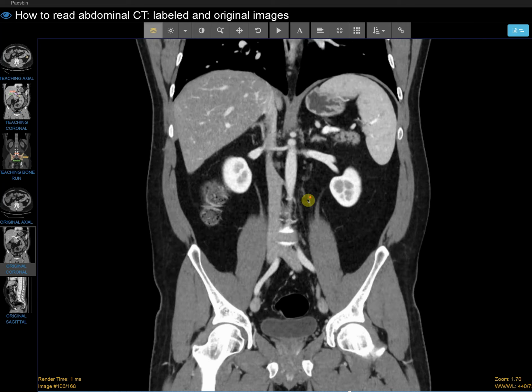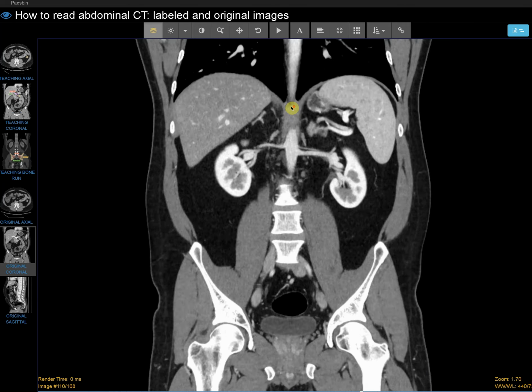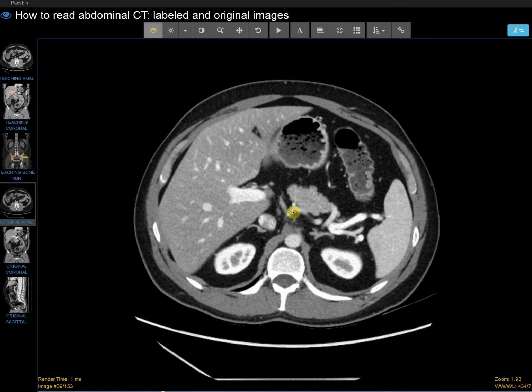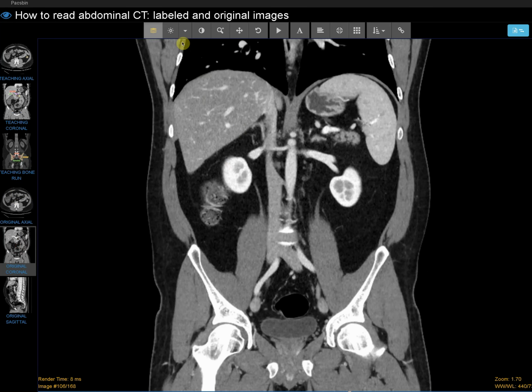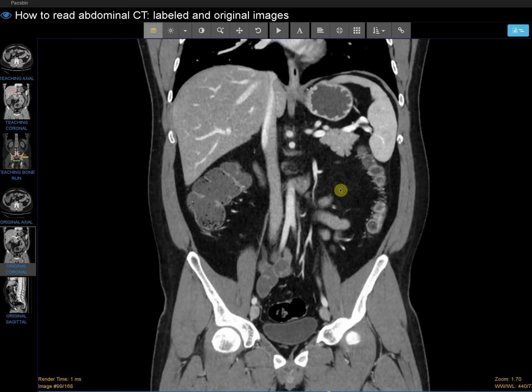After that, let's take a look at the lymph nodes. Again, in my experience, lymph nodes are easiest to evaluate in coronal view. And one thing I'm trying to do in my life is to get myself more familiar with using the coronal and the sagittal images. Because on axial, let's go right here, all we see is the liver, spleen, a little bit of kidneys, adrenal, but in coronal, we see the whole body. We see so much real estate that it's definitely more bang for our buck to use coronal images.